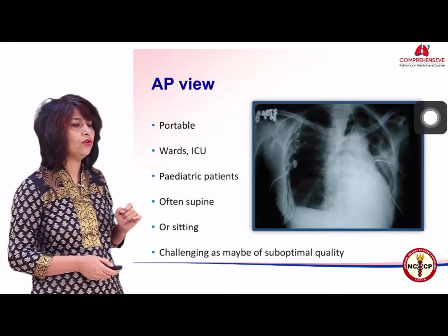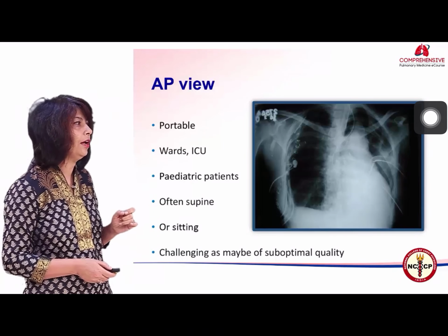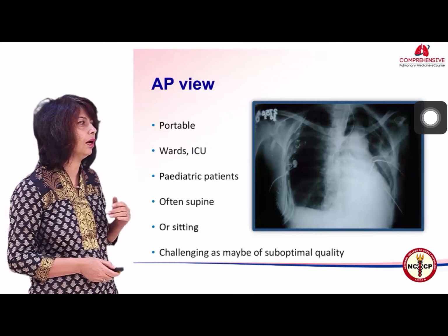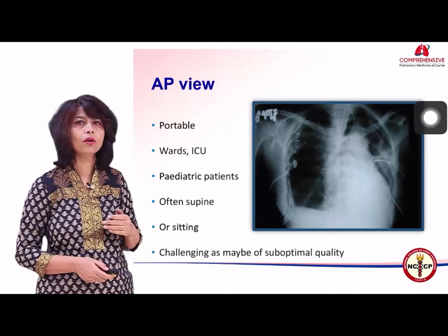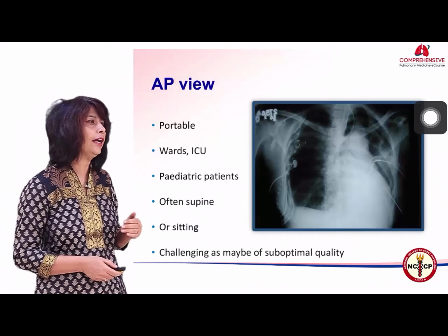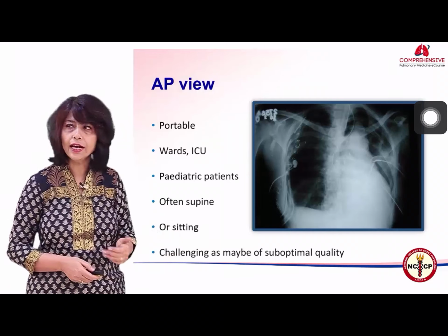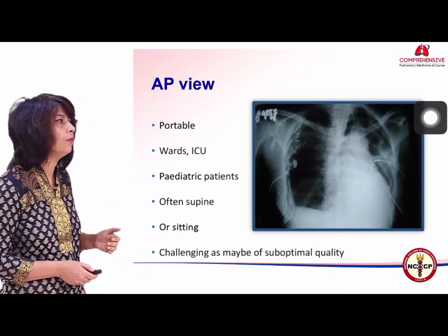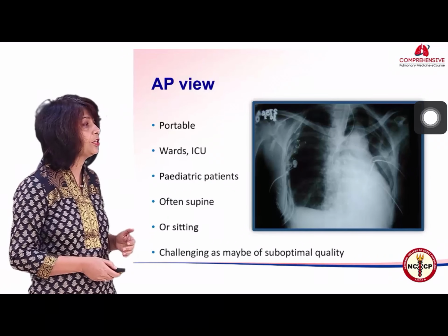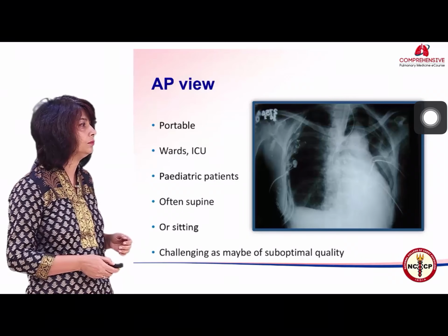The AP view, nobody likes to interpret an AP view because it is difficult to interpret, but you are stuck with AP views because obviously seldom are sick patients able to cooperate for sitting or standing full inspiration views. So, essentially antero-posterior views are performed in wards, ICU and in pediatric patients. So, perforce we do need to get used to looking at AP views, especially as several of them may not be of very good quality also.